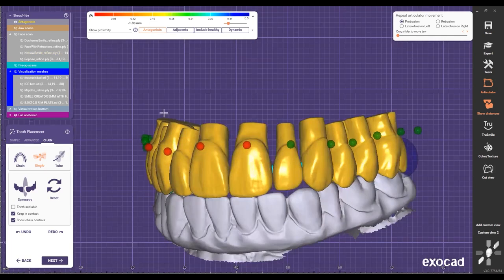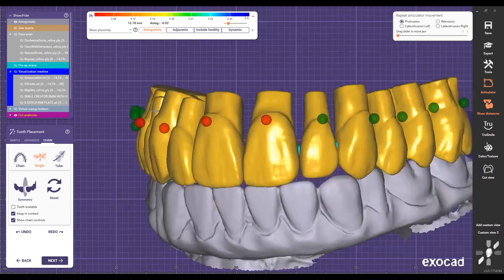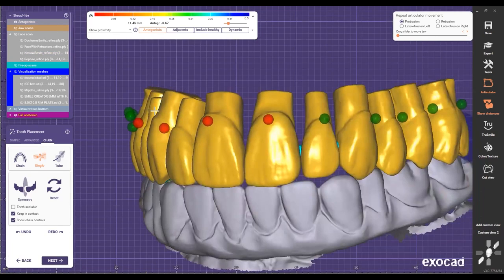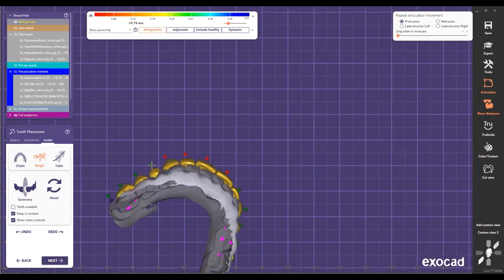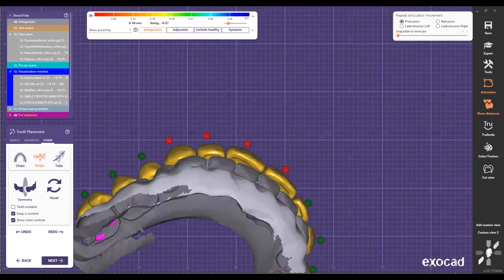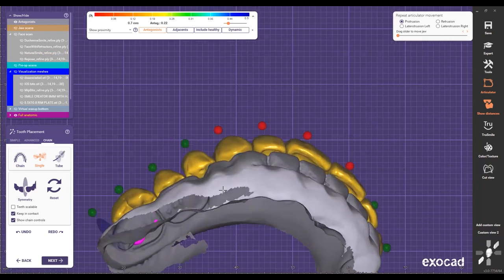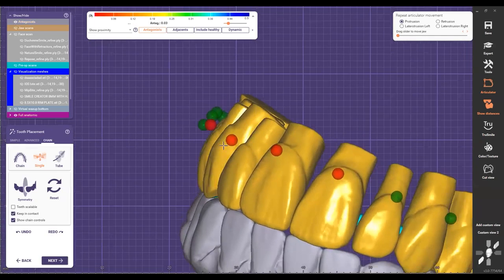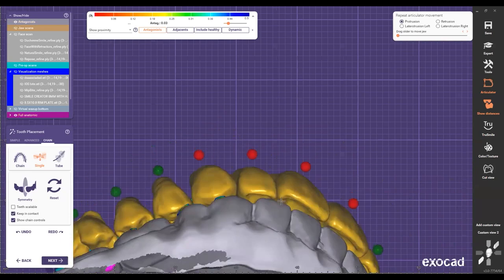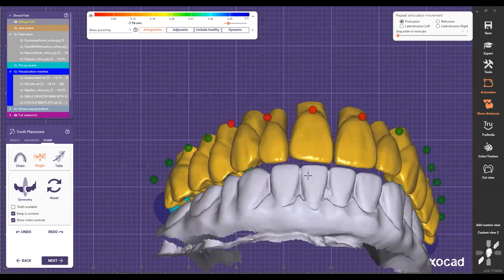And I'm just gonna visualize it from the side and then start moving, I call it the banana effect, right? The banana effect is just looking from the profile. When you put the bananas like that, they look nice. So I like to see that here. So I'm gonna bring this out because I wanna make sure the patient's cheek is not gonna come in the way and I don't want this patient to be biting that. Now from the profile, I can see that it is right there and I wanna just move this tooth right here out. And I see from different views because aesthetically, I want this to look nice, okay?